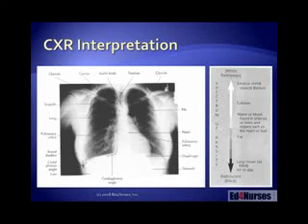Now, a lot of times when we're looking at an X-ray, we get the two confused. So here are some of the things we ought to be looking for on our chest X-ray. This just shows you a bevy of different things that you might want to assess for. Some of the important things are we want to assess the lungs and make sure that lung is fully expanded, comes all the way down to the diaphragm. Go down to the bottom of that X-ray, the bottom part of the lungs there that are expanded. So the lungs are the dark areas on that X-ray.